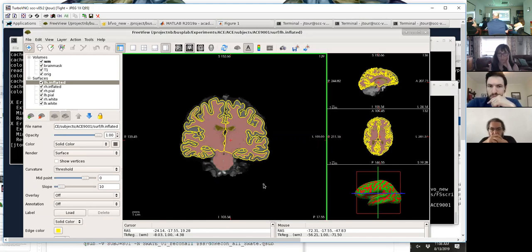You were looking at data and you wanted to look back and you realized that there was a flag that you needed to put in to do another set of analysis. If you added that back in, it wouldn't go to the whole recon. It depends on how you do it. Recon will work from whatever state you want. So what you would do, you would say, okay, where is this flag going to be? And you find it, and then you say, okay, well, I want to start. It literally runs separate. I don't know if you can do everyone individually using the recon all.